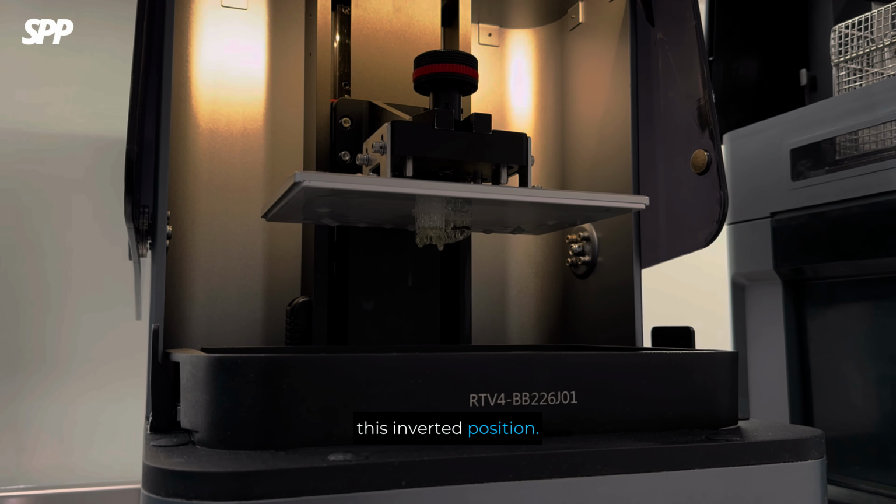There is one important step to prevent the drill from binding during surgery. I use a hole trimmer to refine the drill hole. Different hole trimmers are available for each size. I trim the hole from bottom to top and then from top to bottom. About 5 rotations are usually sufficient.